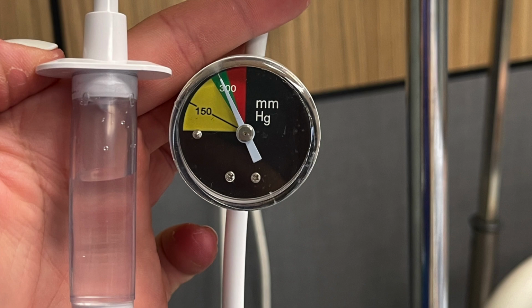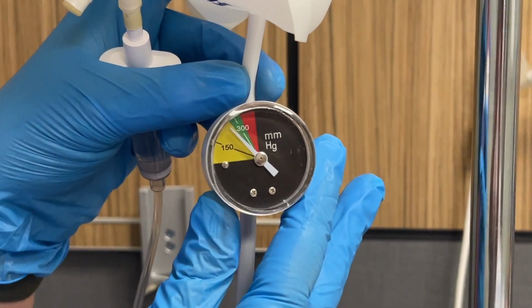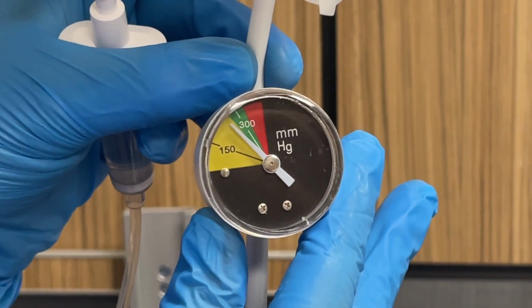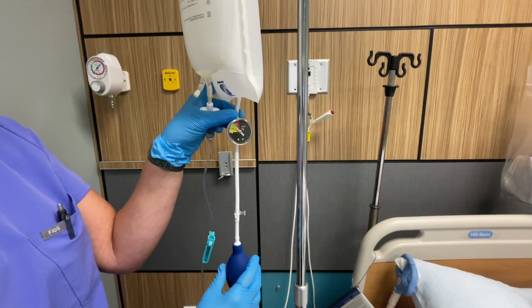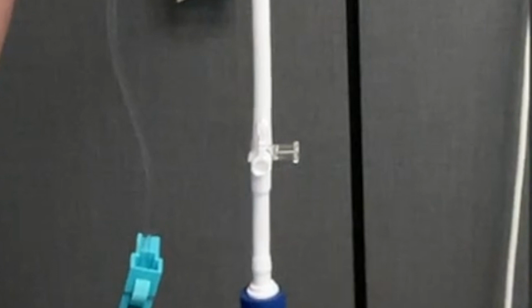Today we have two different bags that we will review. The first one's pressure is monitored via a dial, and the second one is monitored via a pop-out mechanism, both of which you can visualize that green color indicating that pressure is adequate. In the event the manometer is below adequate pressure, you can simply inflate the pressure bag until there is adequate pressure in the green area. The pressure bag is equipped with a bulb similar to a blood pressure cuff bulb. It has a three-way stopcock on it as well.